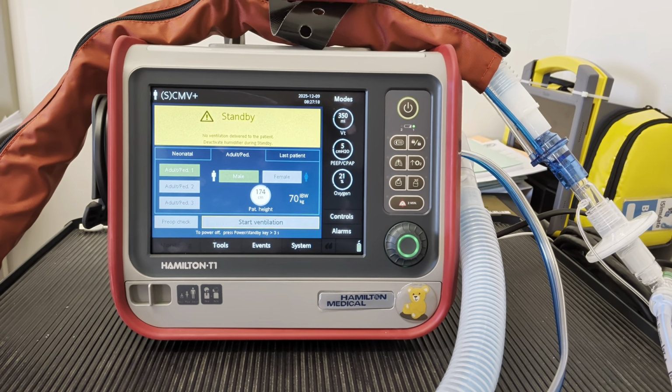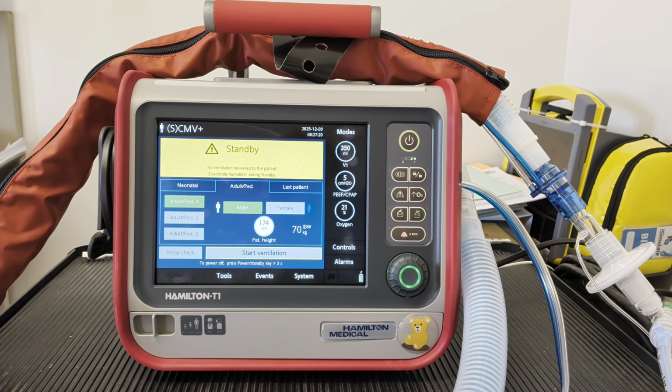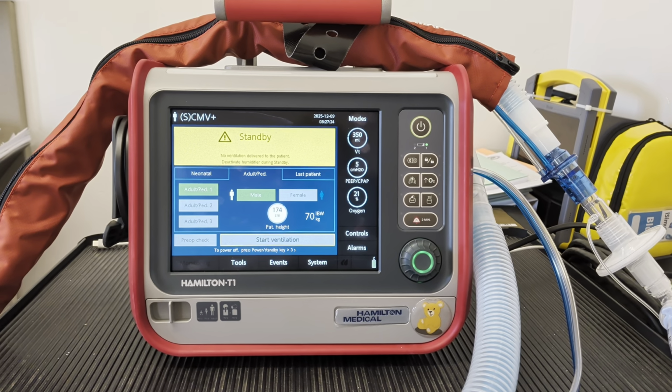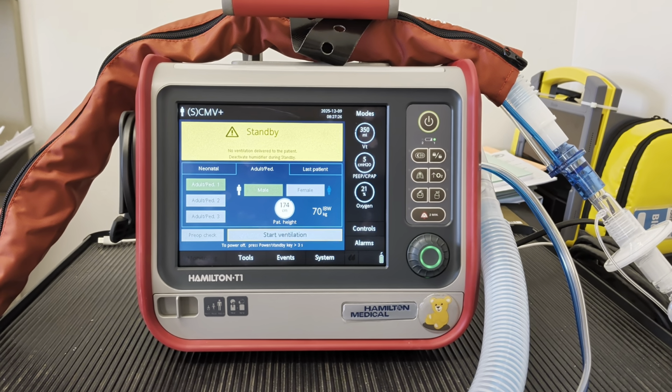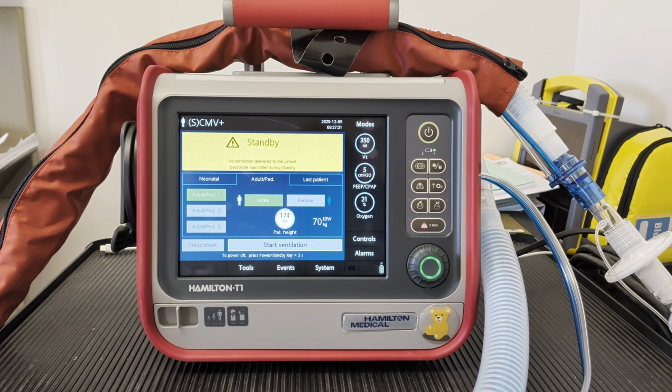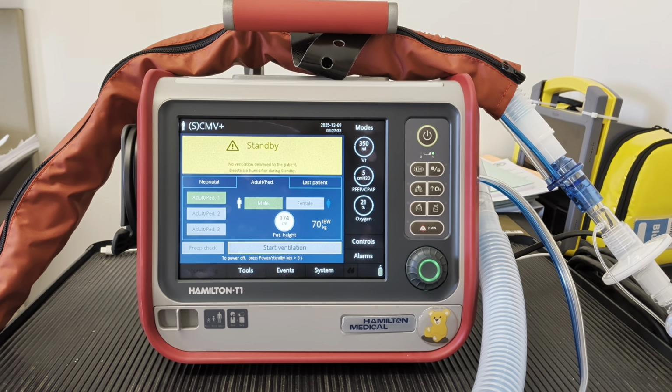In this particular video, I'm going to talk about the two primary categories of pulmonary pathology that you are commonly going to encounter and have to deal with when it comes to mechanical ventilation. And that is obstructive and restrictive pulmonary pathology.